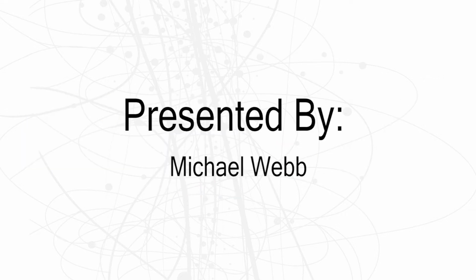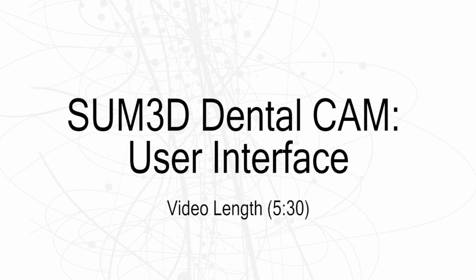We're the software developer for the SUM3D Dental CAM software, and today I'd like to give you an introduction to our SUM3D Dental CAM user interface. So we'll go ahead and start out by opening up SUM3D.